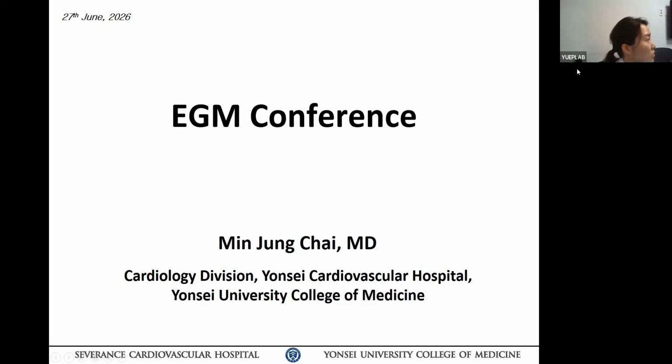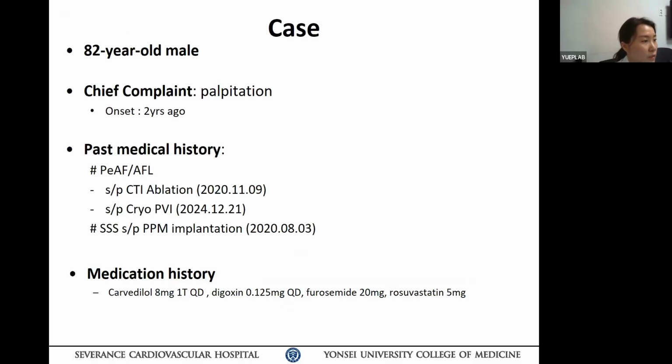Okay, I will start the EGM conference. I'm Min Jung-chae from Severance Hospital. This case is an 82-year-old male patient. He has had palpitation since 2 years ago. He had a history of persistent AFib and flutter and underwent CTI ablation in 2020 and PV isolation in 2024 with cryo. Due to sick sinus syndrome, he had a conventional permanent pacemaker implanted. He takes carvedilol and digoxin.